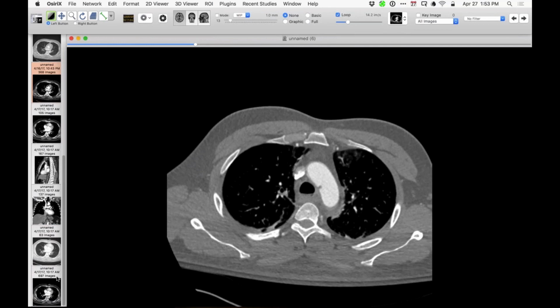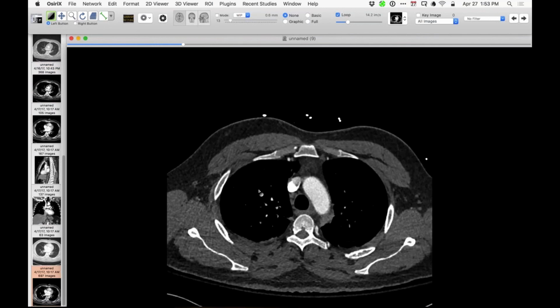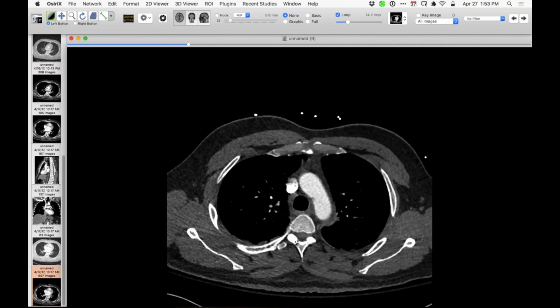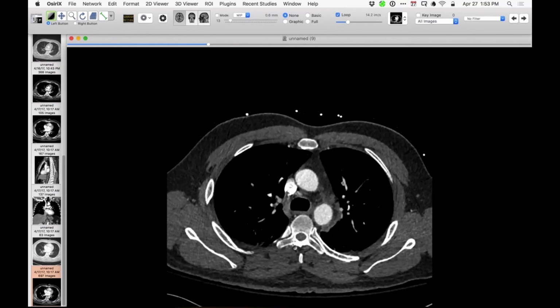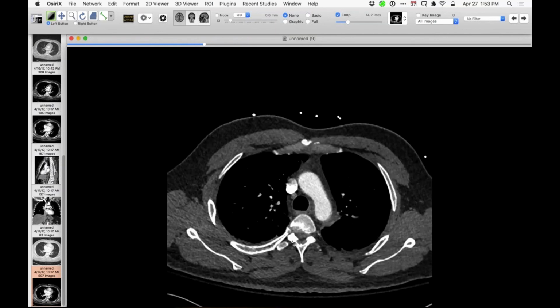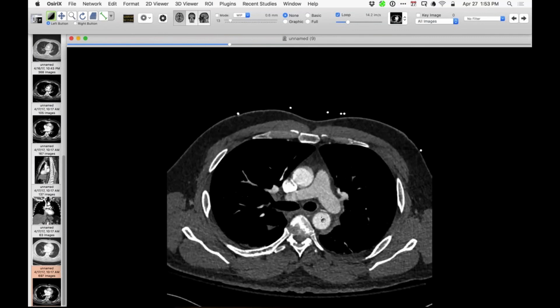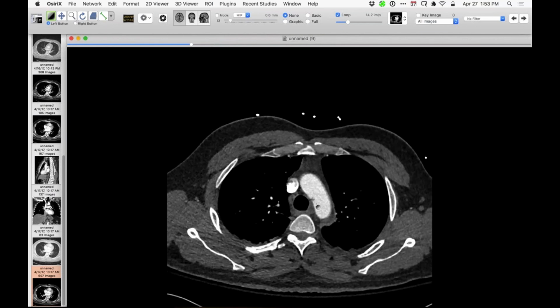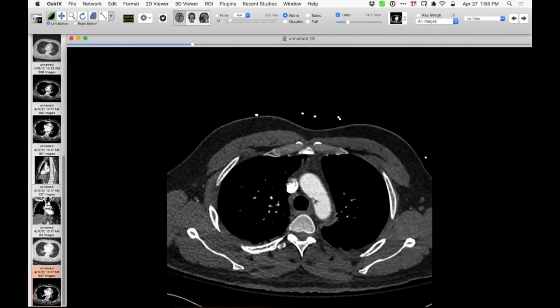He had another exam, I think, just to clarify that this is a real thing rather than a pseudo defect soon thereafter, but there it is again. And yes, he did have an endovascular stent graft placed to manage both lesions, really. But this one should heal. So this one should not be treated with a stent, if it's the only one. This one should be described as a type 1, for which a stent is not required, just observation.